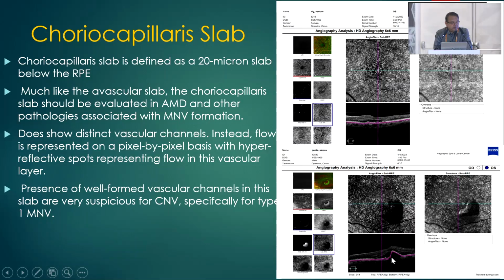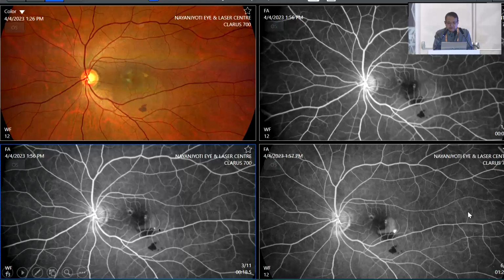segmentation line, we have used an RPE fit. And the segmentation line automatically goes and marks the pigment epithelial detachment, and this takes care of projection artifacts. And here you can see there is a polyp. This is one of the patients, who has a subretinal hemorrhage. There is a CSR-like serous detachment at the posterior pole.